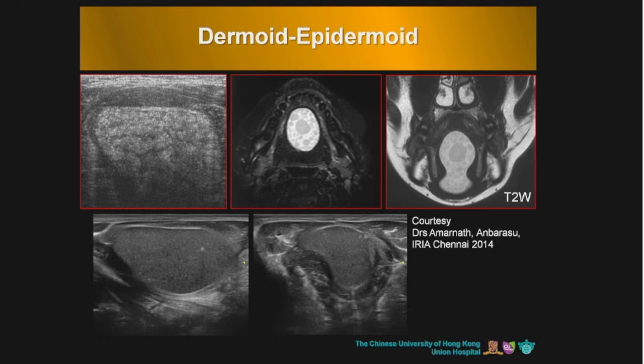Distortion of anatomy or loss of normal anatomy is your first clue that there is something over here that should not be there, and you see this large mass which contains fat inside it. This is bright, it's echogenic, it's got small so-called nodules inside that, and at that location this is most likely going to be dermoid, and when you do an MRI you see that sac of marbles appearance that is classically described for a dermoid. So here your clue was lack of normal anatomy.